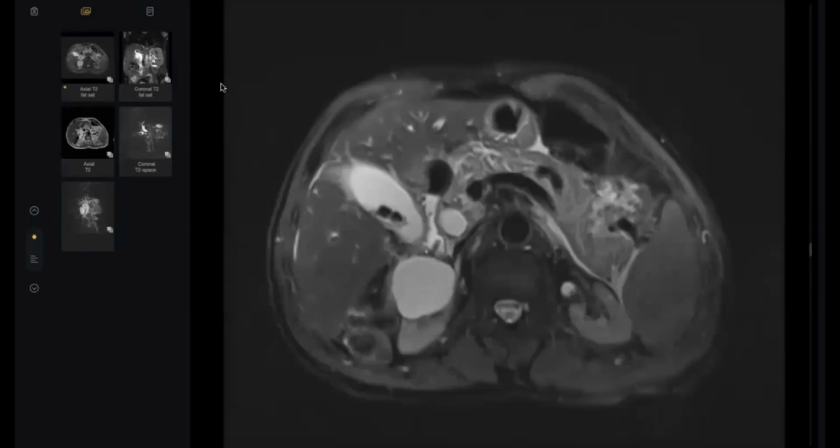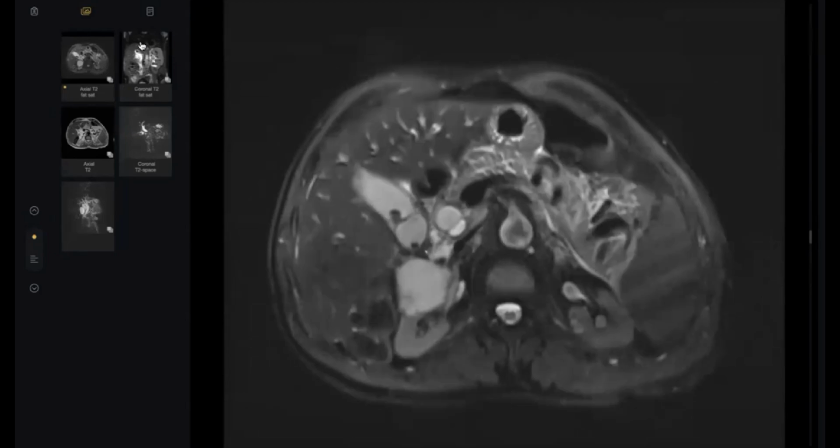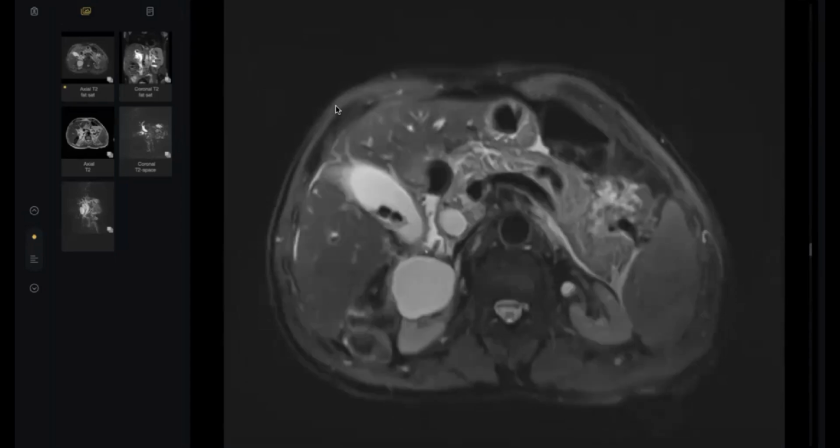My advice for all of you, look at the patient's age. When you see that the patient is older, in CT abdomen or MRI abdomen, tell yourself the pancreas will trick me, will confuse me. Why? Because this looks like the normal size of an adult, and there is minimal pre-pancreatic fluid.